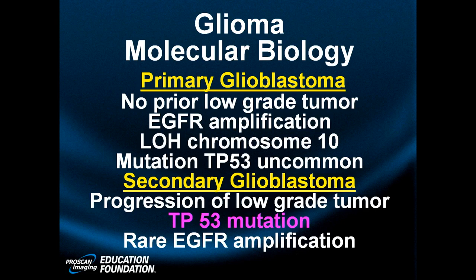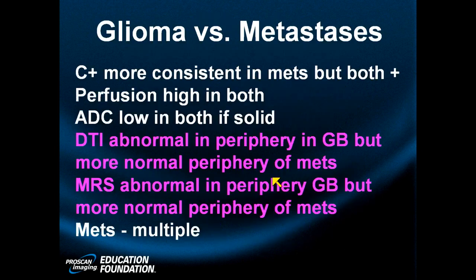You're being a consultant, and the complete opposite would be said with a primary glioblastoma. Now, what about a glioma versus a met? You would think that a malignant killer lesion like a glioma, especially anaplastic astrocytoma and GBM, would have a more consistent enhancement pattern. They don't.